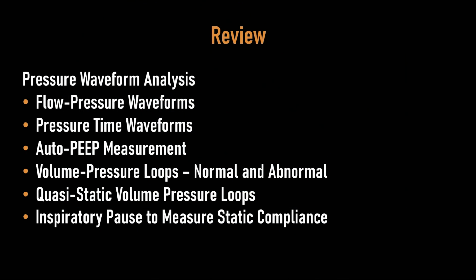Let's review this tutorial. This was a tutorial about pressure waveform analysis. We started with a discussion about flow pressure waveforms, and then moved on to talk about pressure time waveforms. These are the pressure waveforms that you see on all mechanical ventilators. I subsequently showed you how to measure auto-PEEP on the pressure waveform. We then moved on to talk about volume pressure loops. Often people refer to these as pressure volume loops interchangeably.